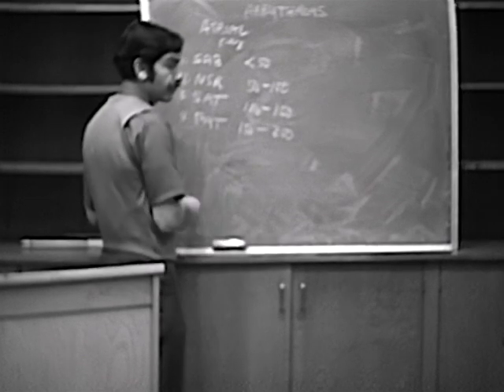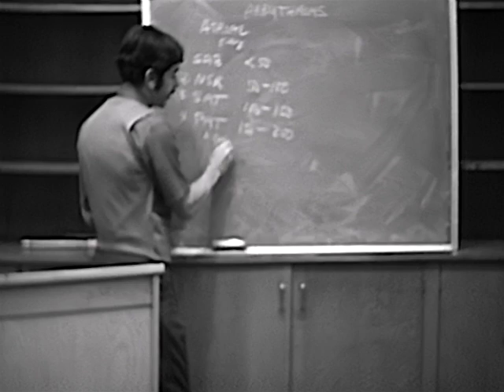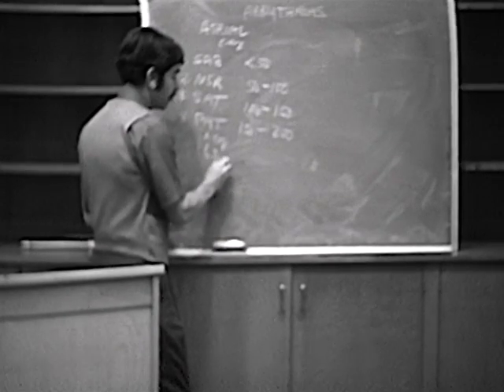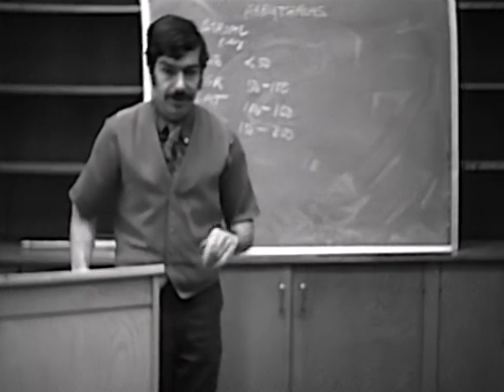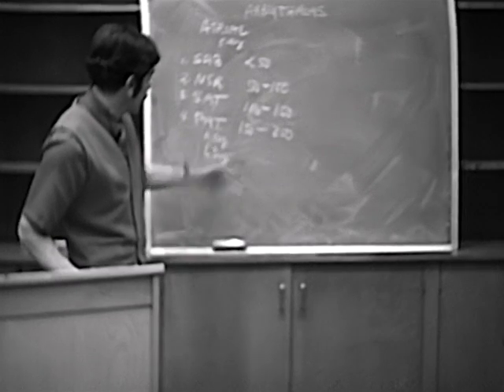Okay, and then PAT will divide into two types. One is we'll call the regular appearing PAT, the kind we're all familiar with, and then we have another kind, which is the digitalis-induced PAT, okay, which is different. And it's important to distinguish that from the regular type.